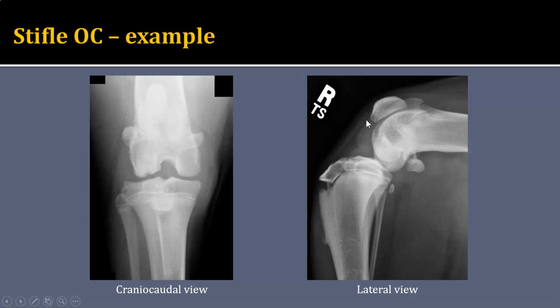What we can see on this patient is quite a bit of intracapsular soft tissue swelling that is associated with this osteochondral defect. This patient is a little bit obliqued on this view. And then there may actually be a little faint mineral opacity here, and that could be an osteochondral fragment from this osteochondrosis lesion. And this is the typical location of those osteochondral fragments, although they could migrate into the caudal joint pouch as well.